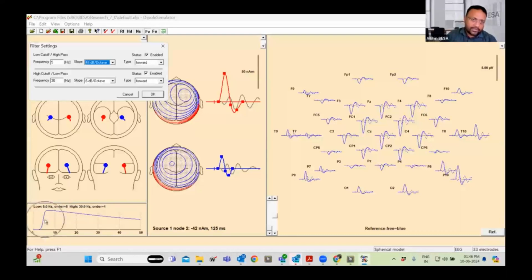If you look at here, you can see that the waveform has totally changed. Instead of this red waveform, we introduced multiple peaks, which means that we have distorted or else introduced artifacts. We have distorted the real waveform, and your results will definitely suffer if you do this.